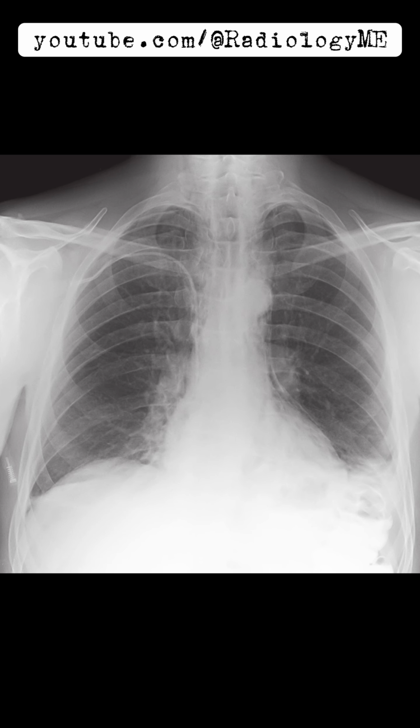There's gas outlining the left heart border and the descending aorta. This is a telltale sign of pneumomediastinum. The streaky shadowing at the left lung base and loss of definition of the left hemidiaphragm also catch my attention. This could potentially represent free gas below the diaphragm, and that makes me think about pneumoperitoneum. We also see contrast-filled bowel outlined by gas laterally, again consistent with pneumoperitoneum.